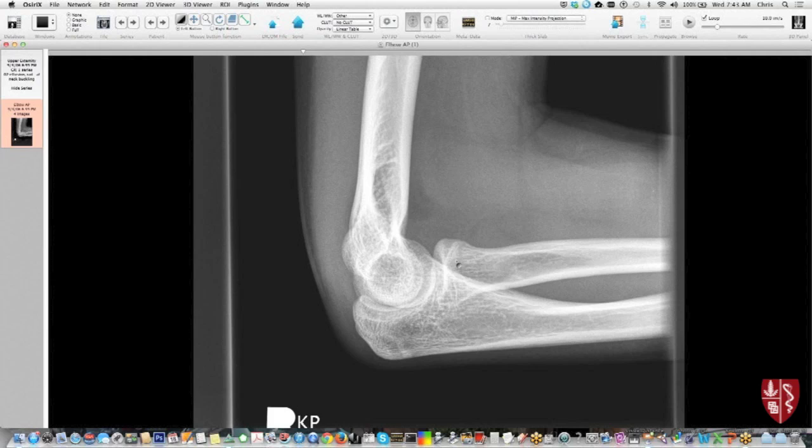We can see effusions to some extent in the ankle, not so much in the shoulder, not really in the adult hip. In the pediatric hip, we can see effusions and things like that. And in the hand and wrist, we can often see joint swelling that helps tell that there's probably an effusion. So simple things to start out here.